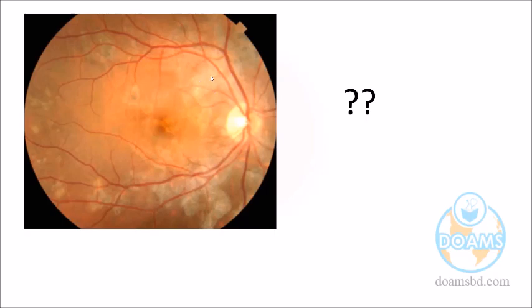No, around the... this white area you mean? The white area, the streaking? Not the white only, but like some kind of vessel going. Yes, it seems to be. But if you look closely, the vessels are always coming from this center, from the optic disc. All the vessels are branches. If the branching were not coming from the vessel, it could be angioid streak.